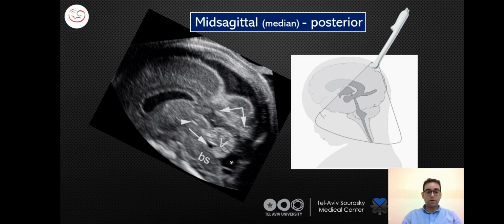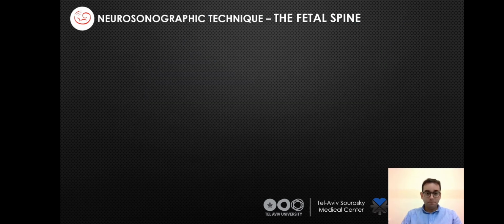And here you should be able to recognize the tectum, tegmentum, and the thin aqueduct filled with fluid between them, the normal appearance of the fastigium of the fourth ventricle, the vermis with its primary and sometimes the secondary fissures also can be obtained, of course the fluid in the posterior fossa, and the shape of the brainstem.